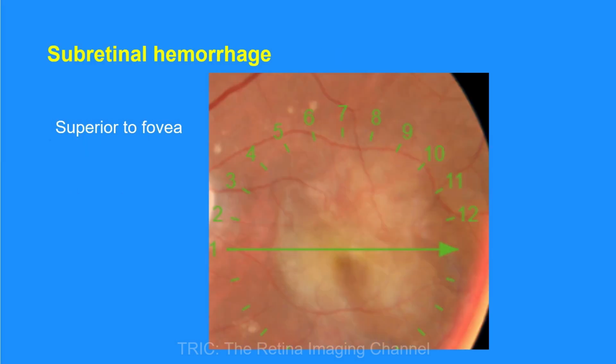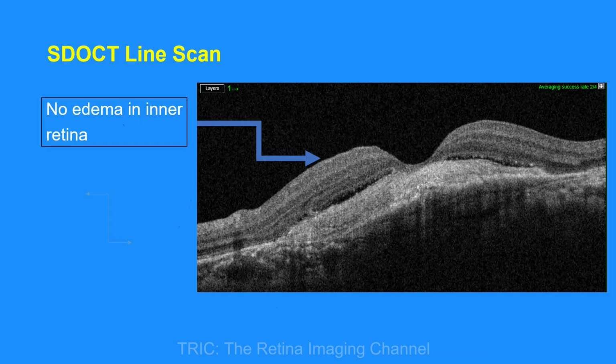However, if we look at the lesion carefully, then just superior to fovea, the area is a little darker compared to the adjacent creamy colored scarred MNV. We have marked this area with the marker, and if we see the area by removing and putting the marker again and again, then we can see that this area is a little reddish in color compared to the surrounding, and this area is reddish because it has some resolving subretinal hemorrhage which is still there, which is a sign of activity.